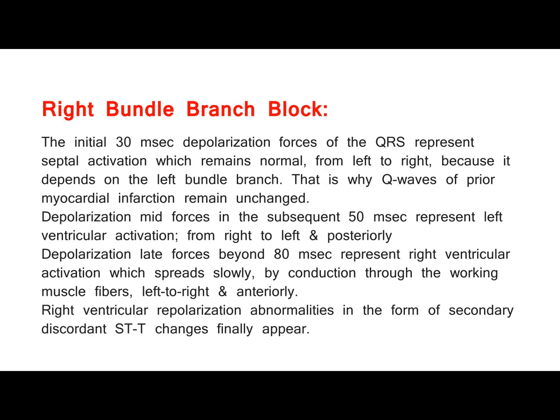Right bundle branch block. The initial 30 millisecond depolarization forces of the QRS represent septal activation which remains normal, from left to right, because it depends on the left bundle branch. That is why Q waves of prior myocardial infarction remain unchanged. Depolarization mid-forces in the subsequent 50 millisecond represent left ventricular activation, from right to left and posteriorly.